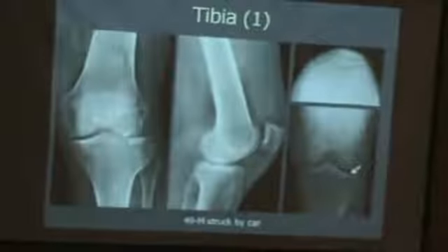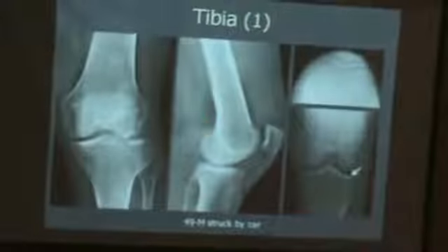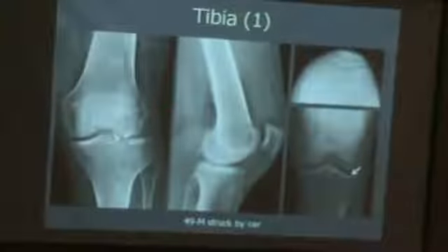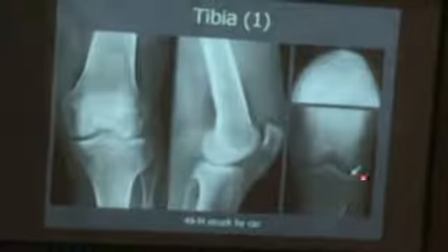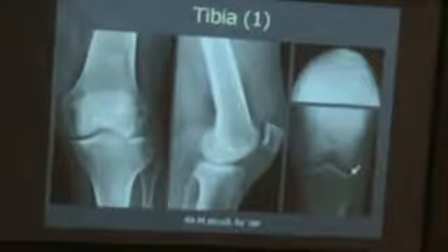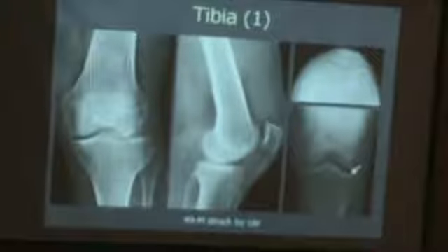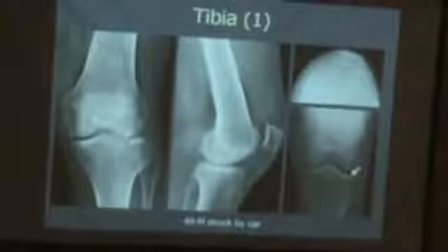So we did actually also an X-ray because it was painful. You see the joint effusion here. But obviously it's a very subtle fracture, maybe visible right now retrospectively. You see it here as well, you see the fracture, but it was very, very difficult. This is an overlooked fracture by the radiologist. A senior colleague of mine, MSK, didn't see it.